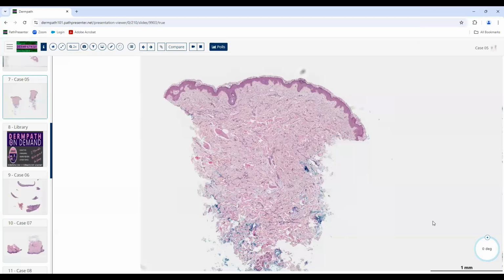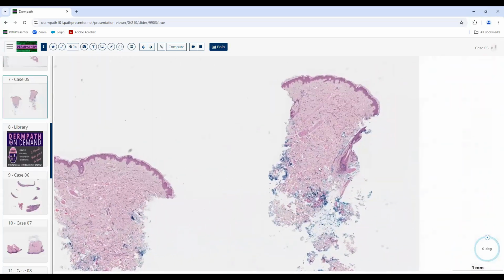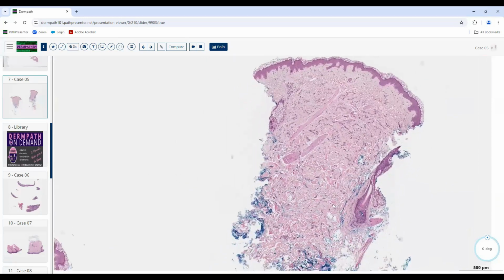Good morning, Dr. Cockerell. This is James. I can take this one. We're examining a punch biopsy here. Actually, the section on the right gives some clues to where it came from. We see some follicles and sebaceous glands, but we don't see any solar elastosis. So I would favor this coming from a hair-bearing region like the back. Good. Or from a young person, of course.